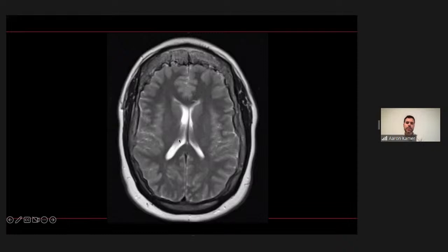So go ahead and just ignore the brain parenchyma itself. Ignore the brain parenchyma. Okay. Just maybe the calvarium itself looks thickened. It does, yeah. Do you know why I might be showing you this in an epilepsy conference?